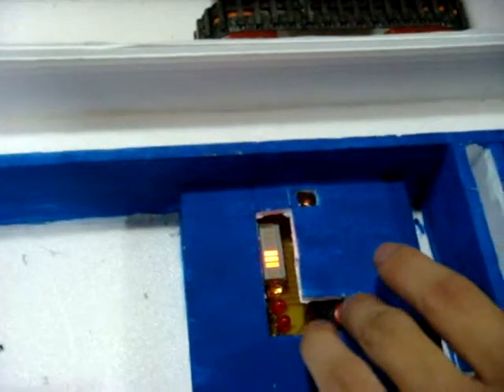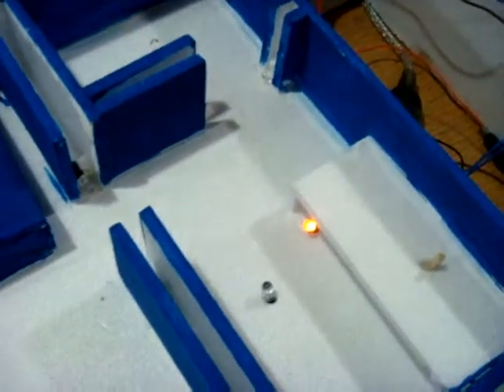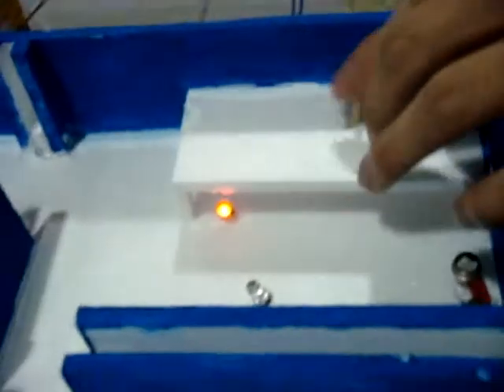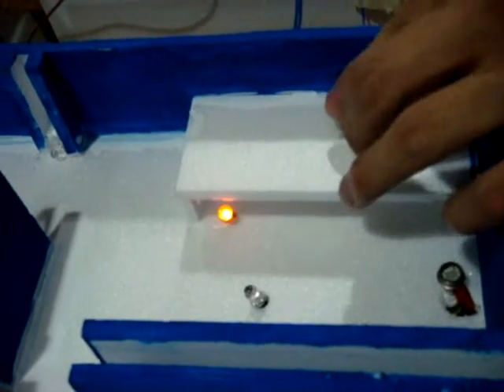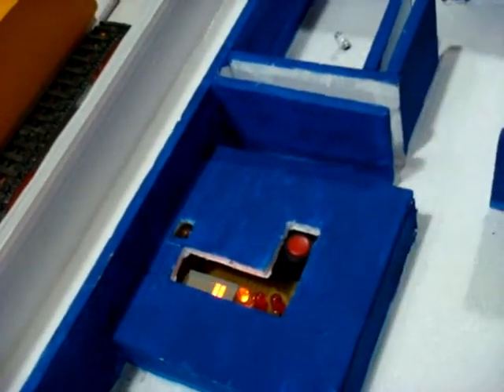Now we'll move on to the night functions. In the night function, the main focus will be patient tracking. As you can see, I'm using a push button to simulate the patient resting on the bed. Once the patient leaves the bed, floor lights will be turned on, and there will be a signal at the control panel stating that the patient is not on this bed.